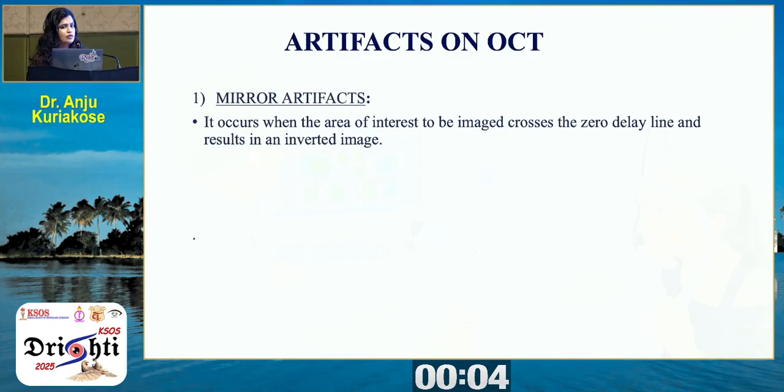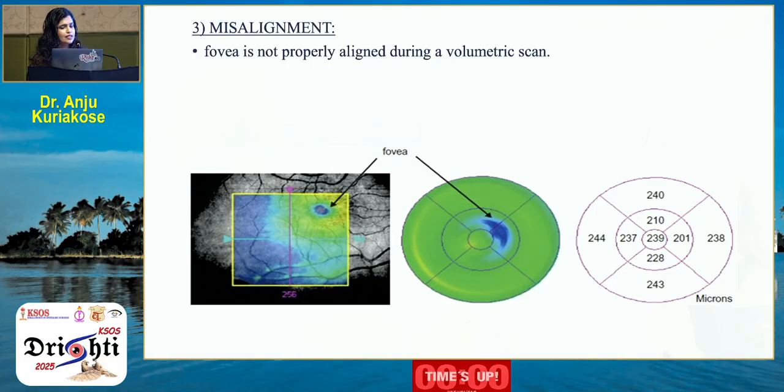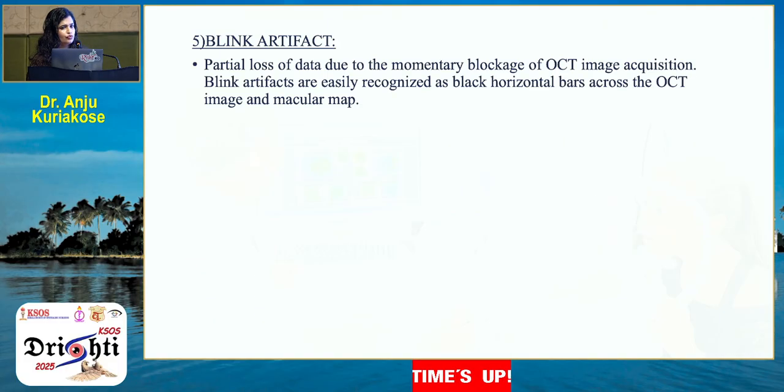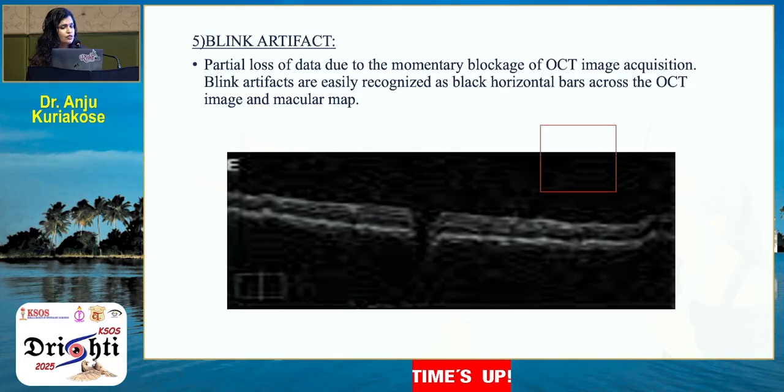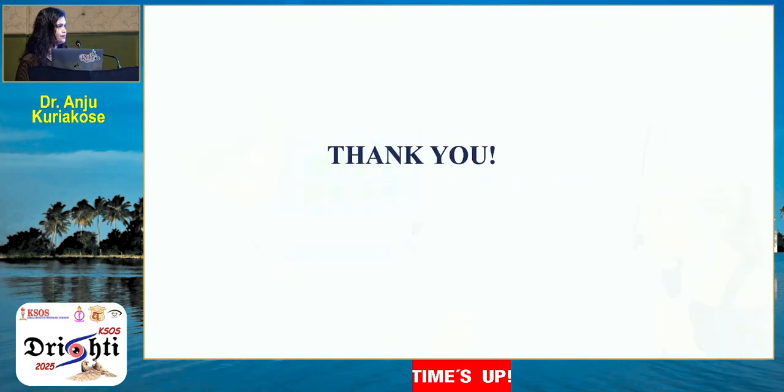Artifacts include mirror artifact, vignetting, misalignment, out of range, blink artifact, and motion artifact. Thank you.